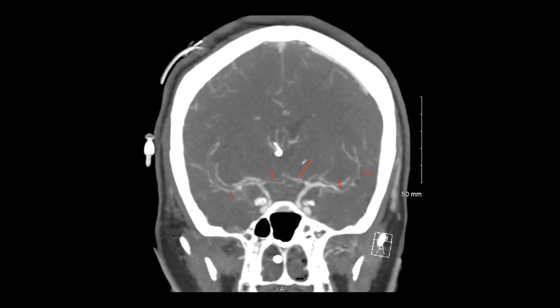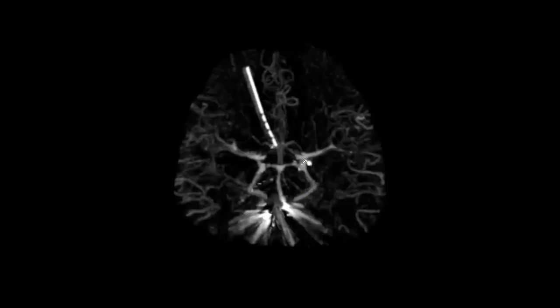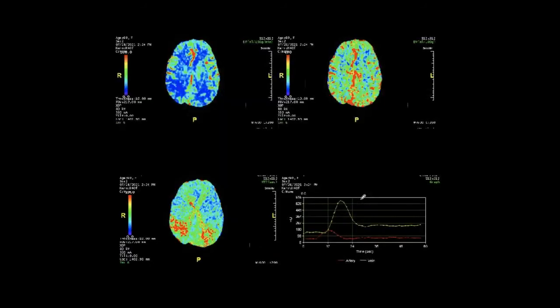So you can see narrowing in multiple vessels, which is relatively new. It just developed because we already have a normal looking study before, except for that aneurysm. See here, you can see the streak artifact from the coiled aneurysm, and you can see the catheter in the ventricle. But if you exclude all that, see how you can see multiple rat bite narrowing. So when you see this, then of course, what are we thinking? We can continue to think while we look at the CT perfusion.